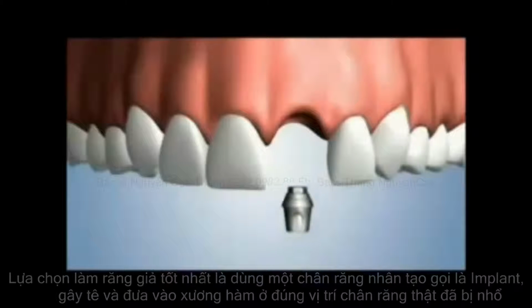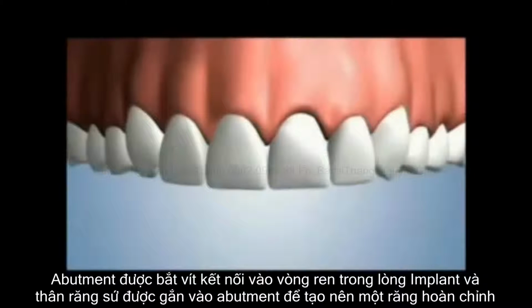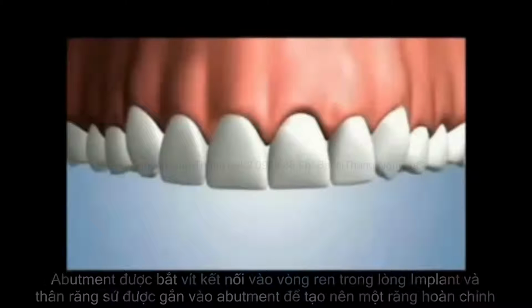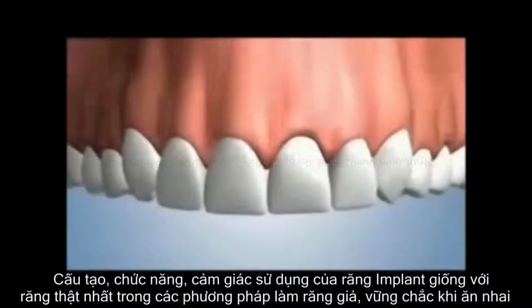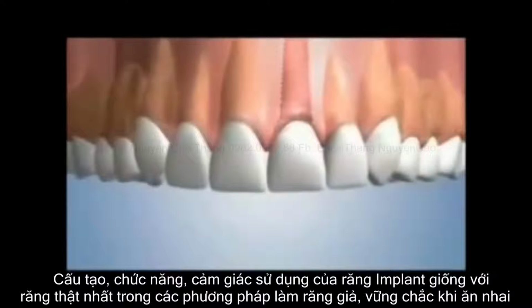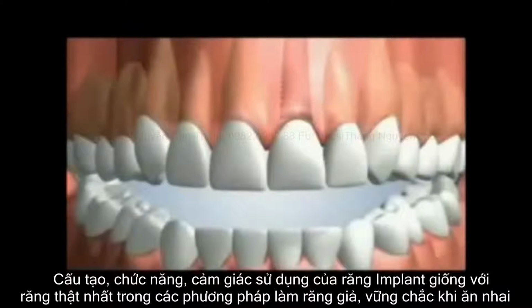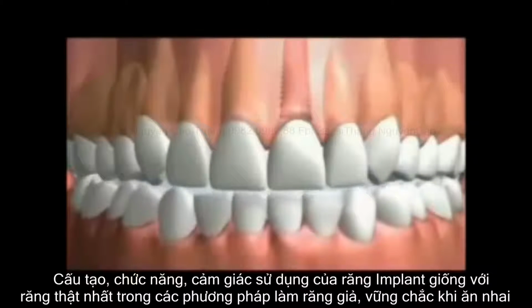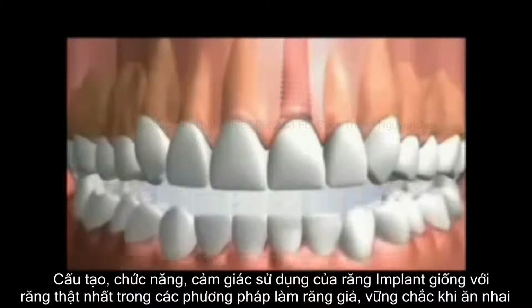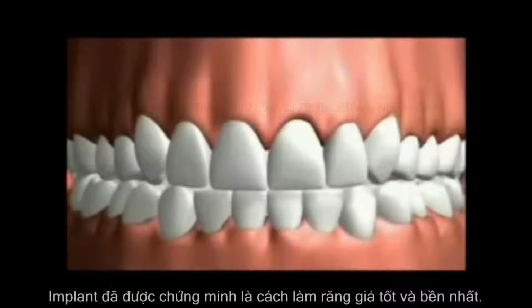the bone. An abutment is secured to the implant, and a crown is secured to the abutment. The dental implant option closely mimics the design and function of your natural tooth. The dental implant is the most secure option, with a solid foundation of bone that keeps it stable, withstanding the forces of biting and chewing. An implant feels and functions like a natural tooth, and it is proven to outlast all other tooth replacement options.